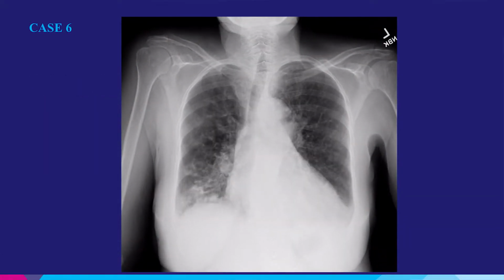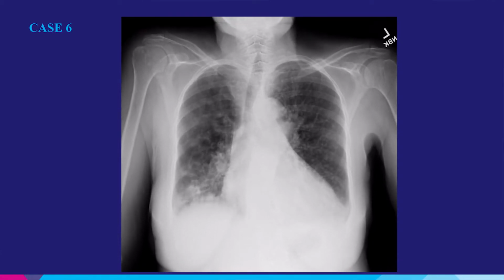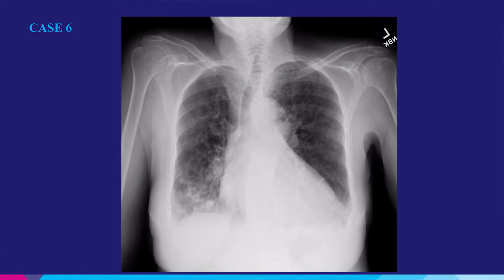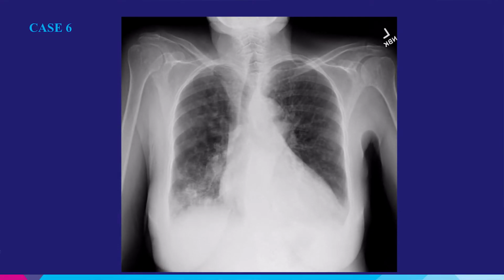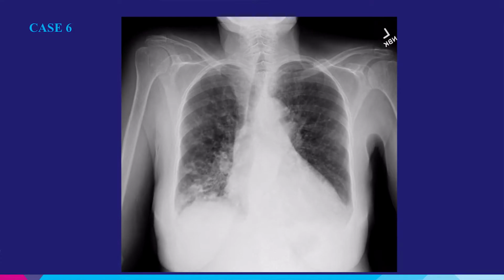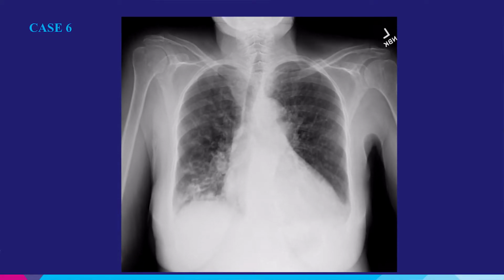As you can see here, now, let's say, look at this tubular structure here. You can follow it towards the hilum, and you can say, well, these are dilated bronchi. And basically, dilated bronchi, and then all those lucent areas that we saw here, they're basically impacted bronchi, and then we actually come up with a diagnosis of bronchiectasis for this patient.